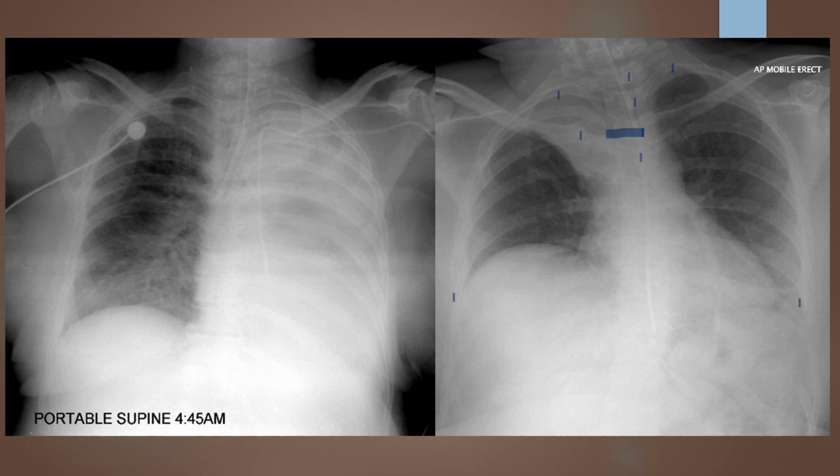It needs to be repeated, but I want to see when I go to do this repeat, do I need to correct anything else? So I'm going to go ahead and go to my midcoronal tilt. I'm looking from my apex to my clavicle, apex to my clavicle. It's about 1 inch. So my midcoronal tilt along with my central ray angulation is going to be pretty accurate here. So that midcoronal is relatively decent. My central ray angulation is relatively decent. I really just need to get in there and manipulate my patient's midcoronal plane.